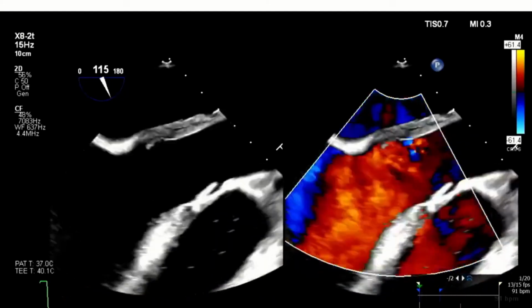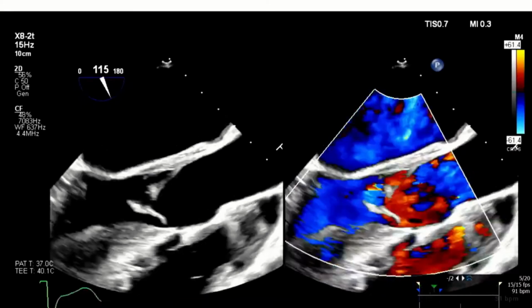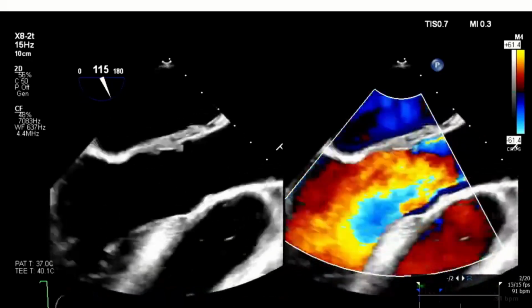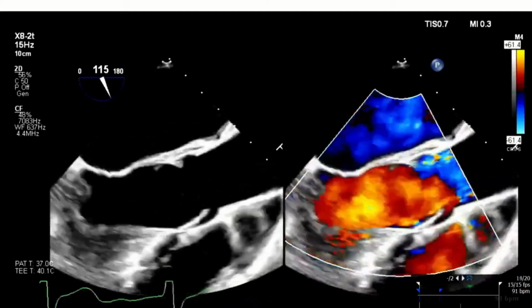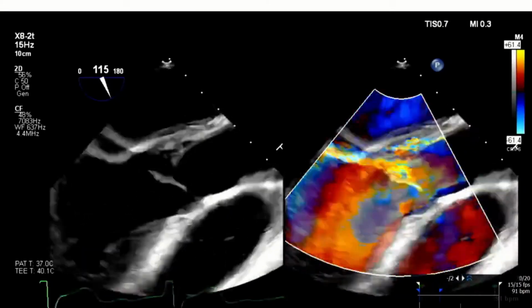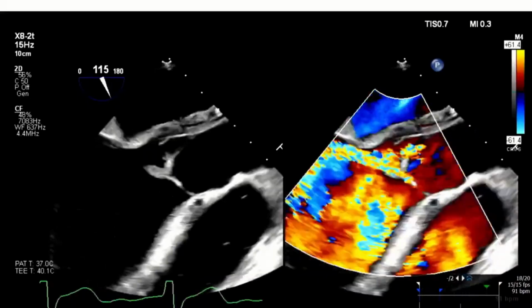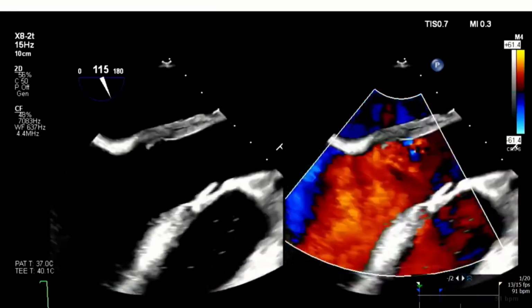This is most likely an acute aortic regurgitation, not well tolerated. This is the patient who is going to go to the operating room the next day or pretty soon after, once the blood cultures are negative, because this valve will need to be replaced. And just because I get this question a lot, these patients cannot have TAVR right now, though maybe in the future. So this is a surgical replacement of the aortic valve.